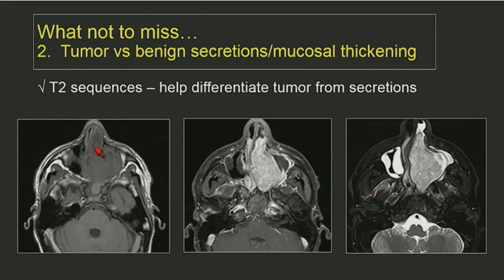The T1 images without contrast are so critical. You can see here this tumor is not in the subcutaneous tissues, and there's only very early involvement of the pterygopalatine fossa. I see many groups in my area put fat saturation on the pre-contrast T1 images. I would really recommend not doing that. You lose the beautiful high signal intensity fat. And this T2 image nicely stages the tumor.